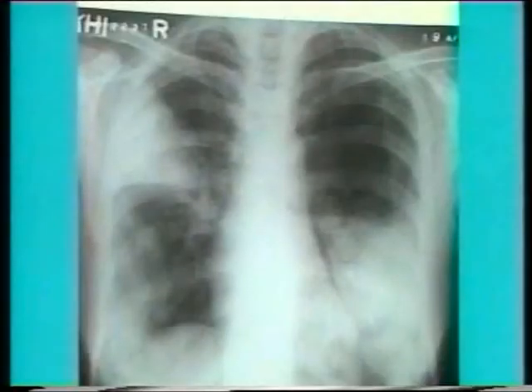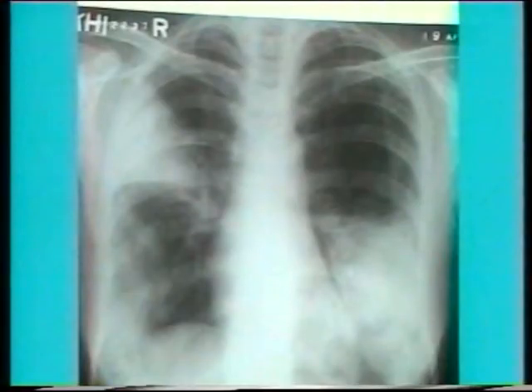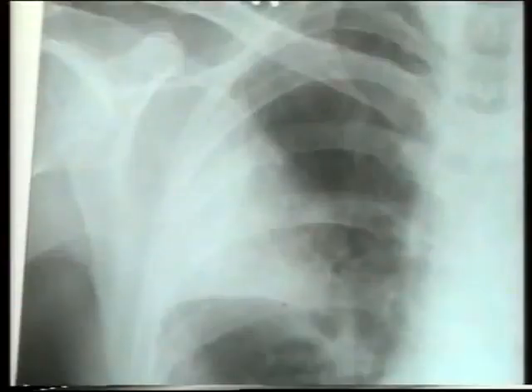This X-ray shows consolidation at two places. Firstly, in the right upper lobe, affecting the apico-anterior segment, and in the left lower lobe. In close-up view, note the uniform opacity characteristic of consolidation and the sharp delineation of the apical anterior segment lined by the transverse fissure below.